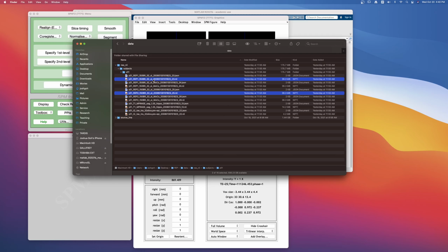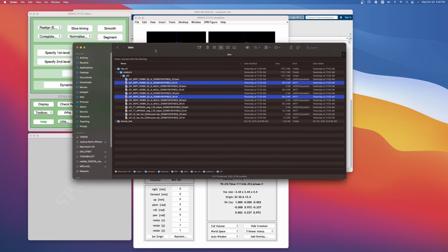assumed. And then also, after performing the inter-session alignment of the first volumes together, SPM will go ahead and apply intra-session alignment, and that's to bring all the remaining volumes, volume 2 onwards, to the same positions as the first volumes of each session or each run. All right, so in this way, all volumes can be said to be brought to the same location as the first volume of the first run, if that's your reference image. And in this case, that's what we're going to do.